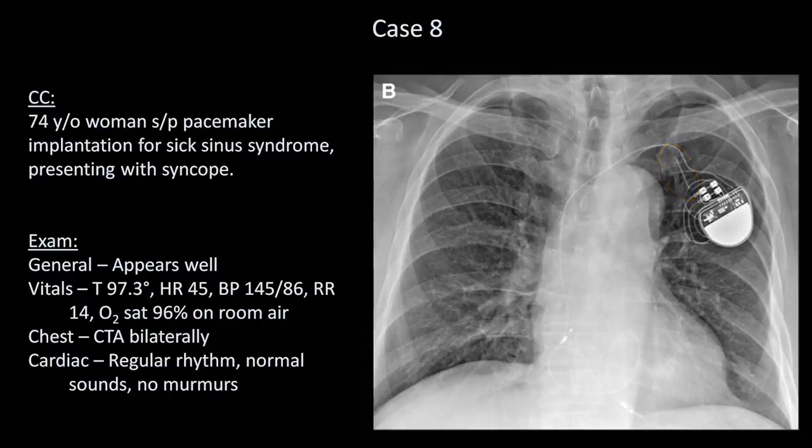That is actually a fragment of the right ventricular lead, which seems to not be present along its usual course in the subclavian vein and SVC. But if we look down here, there's the lead coiled up in the right ventricle, and it may even be looping back through the tricuspid valve into the right atrium. It's kind of hard to tell.